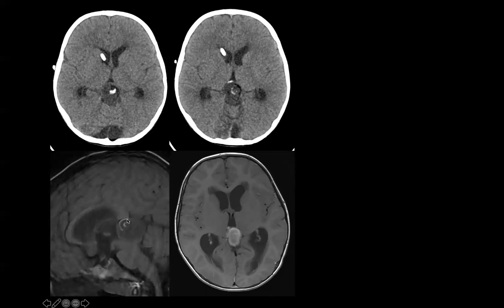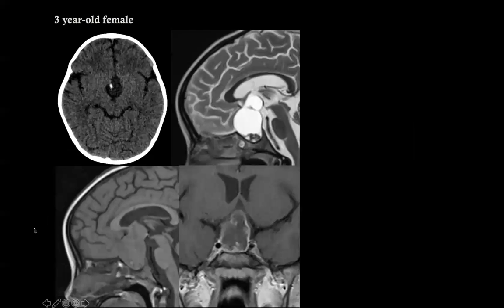This is a form of non-germinomatous germ cell tumor, and this is a teratoma, and it shows just the usefulness of T1 pre. So very, very important to use all the sequences depending on the case.